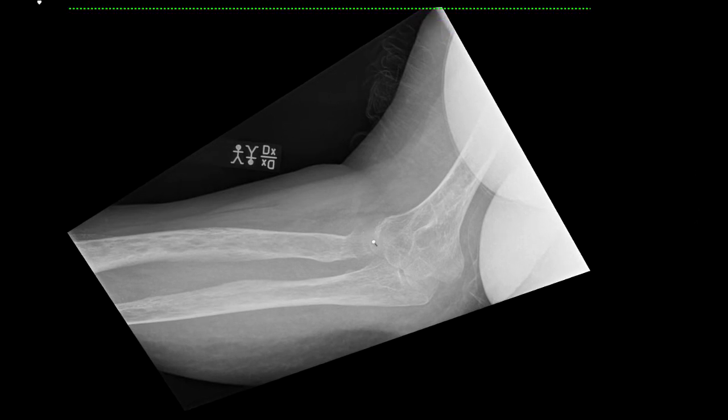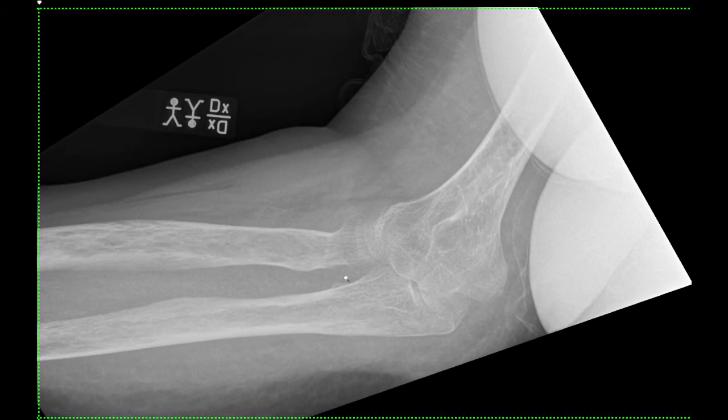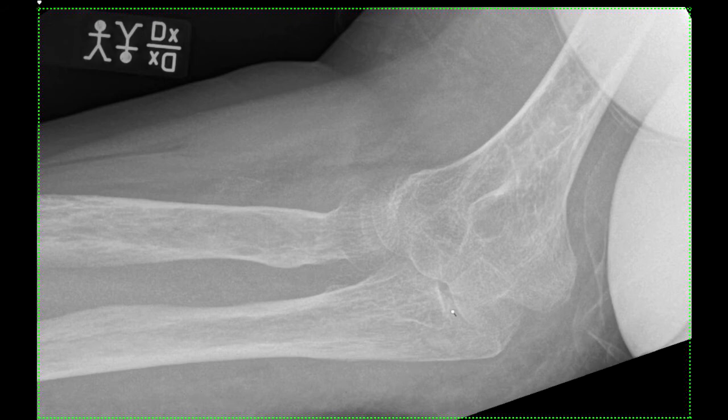Here, it's just so hard. I mean, you try to look on the cortex, everything, you try to zoom in all the way you can, but it's not really obvious. I mean, all you can do is cry when you see this stuff. So let's see what else we have.